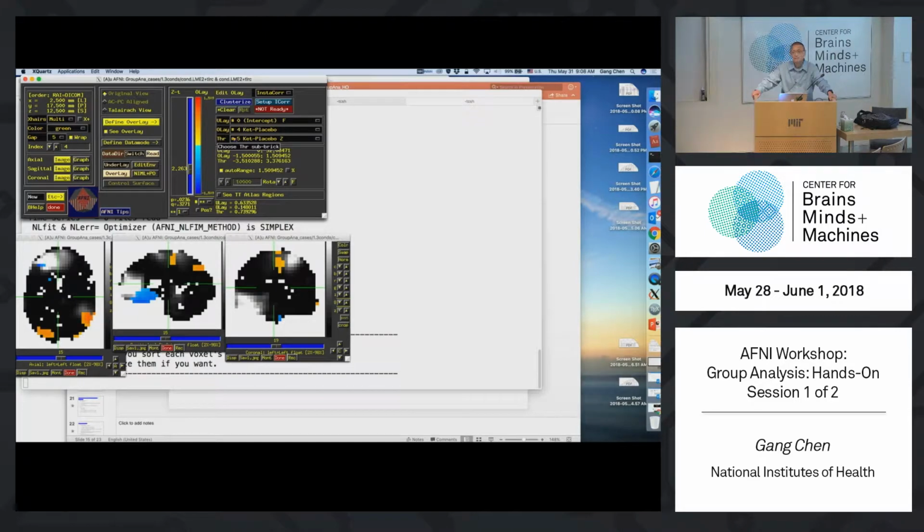Right? Yeah. I've got all the same stuff to do, but I have a black background instead of a white background. Oh, I changed my default setting. Okay. Yours is the real one. Usually I don't like the black background. Okay. I think there's an option that allows you to change it. I don't remember where, but if you like it, I can tell you later what change you need to make to get that. Especially when I save the images to put in the paper, I don't like the black background. When people print it out, they waste a lot of ink.